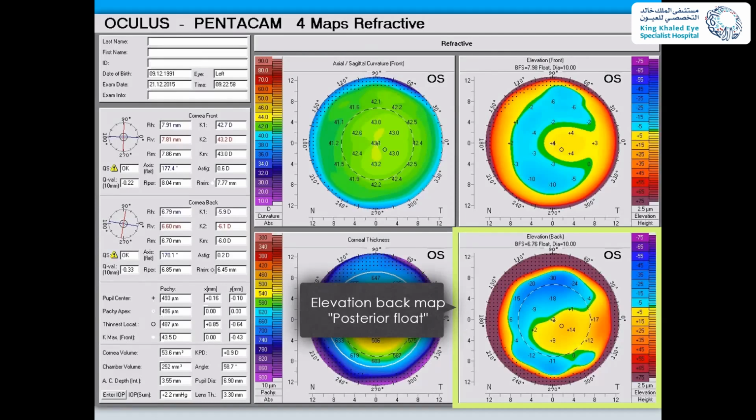I think topometric is important. It doesn't tell you how much improvement you will get. What it tells you is how effective it may be. So it's an indirect way of saying. Let me put it another way.